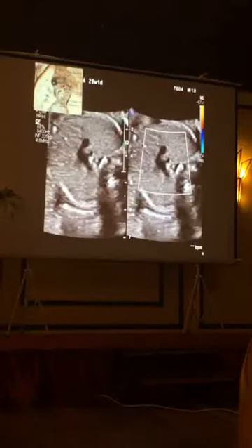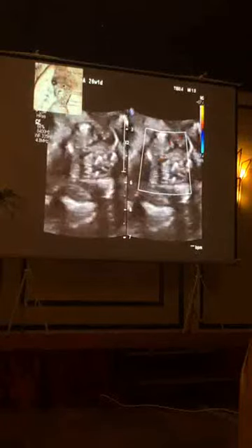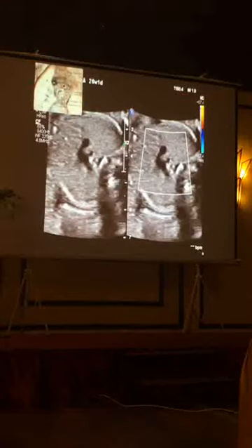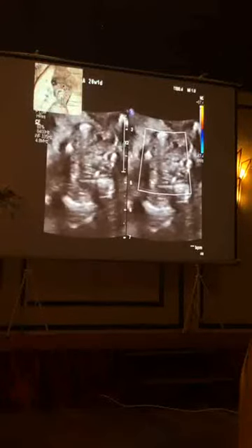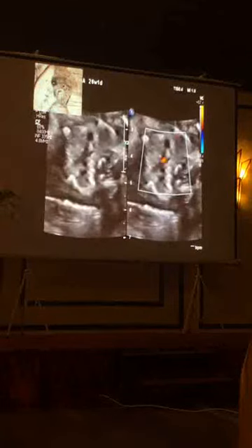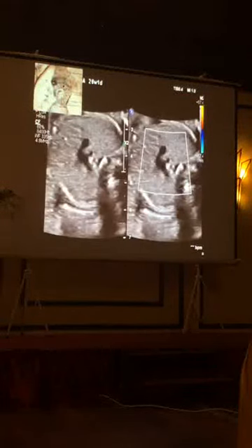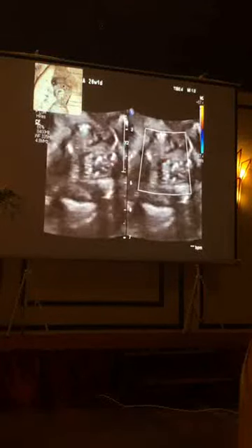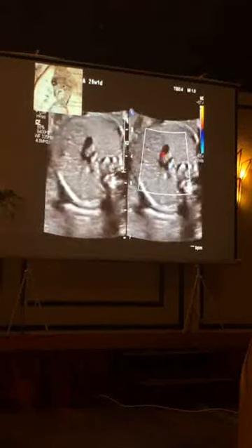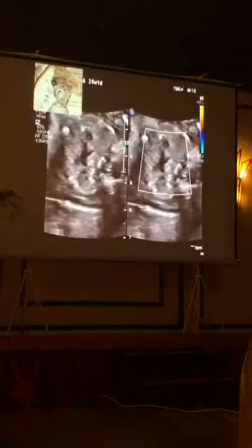So, when you look at three vessel views, first of all, you have to make sure that you are looking at a proper scan, because a lot depends on your angulation of your transducer and how high you are in the chest. So basically, it was very emphasized a couple of times. The best way is to do a sweep and start from the abdomen, scan up to the three vessels view, because then you will have the overview of everything, just like pick up an image and try to interpret this.